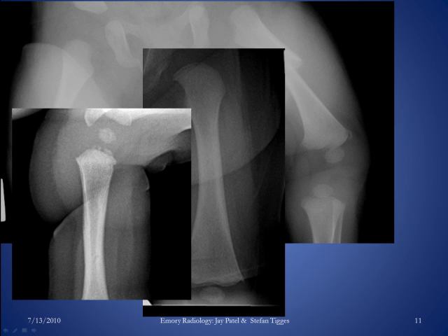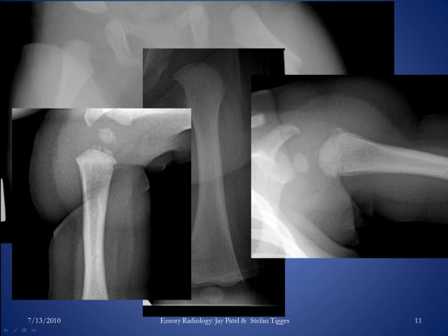This is another image basically demonstrating injury to the metaphysis. And yet again, in the humerus, we're seeing classic metaphyseal lesions proximally with just slivers of bone where they should not be. So just going over classic metaphyseal lesions, these are virtually pathognomonic of child abuse. You will see them in the distal femur, the proximal tibia, the distal tibia, and the proximal humerus most likely.